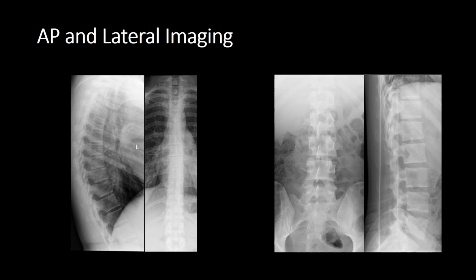Check to see that you've got a slight posterior concavity to the vertebral bodies. That's normal, that's important. Check you don't have any wedging, any undisplaced fractures. Don't forget to look at the soft tissues as well.